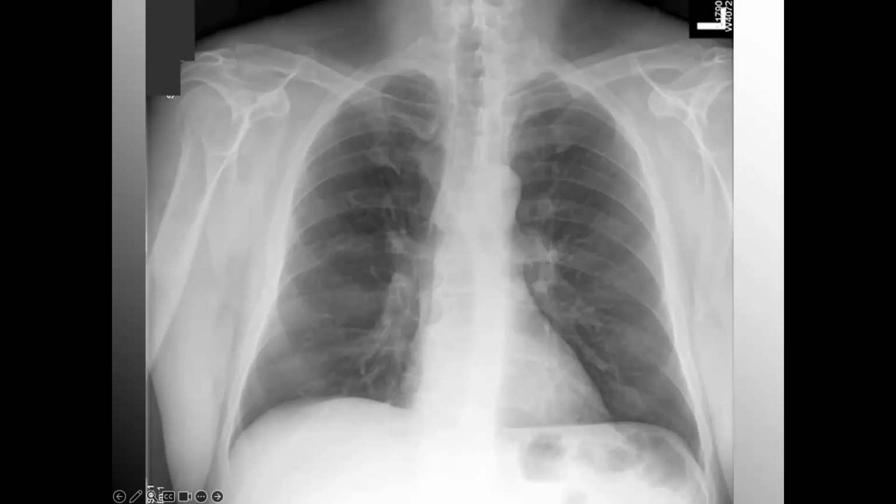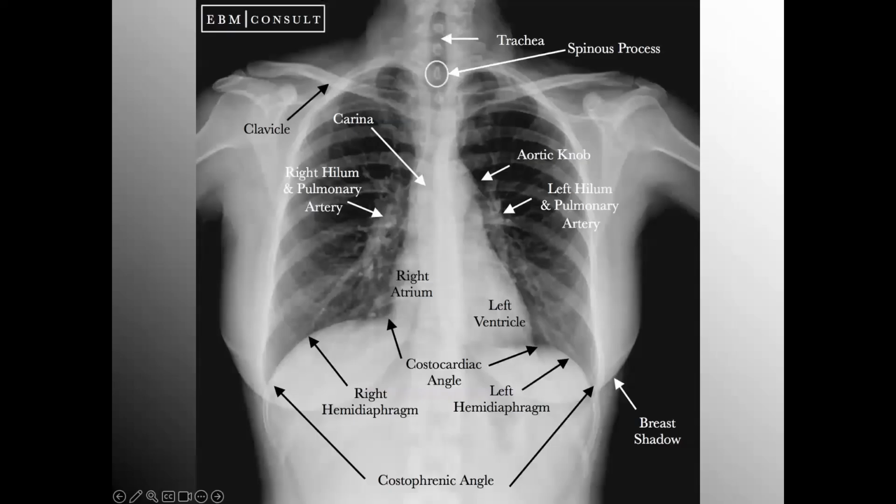This is an anterior posterior chest x-ray, meaning it was shot from front to back. Most patients that are quite ill, that are in the acute care environment, that are non-ambulatory, they will typically have an x-ray shot while they're still lying on their back. The film is put underneath them and the x-ray beam goes from front to back, and thus the name AP, standing for anterior posterior.